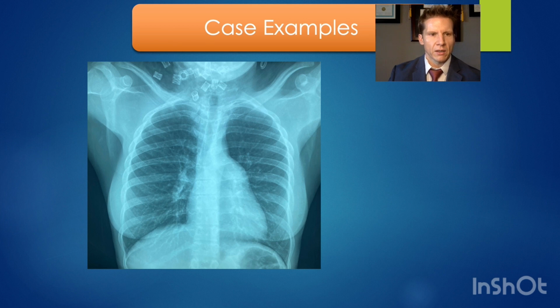And as we are going down, looking at the trachea, it's midline. Aortic arch is here on the left. And we're looking at the right heart border, that's normal. Left heart border looks normal. The size of the heart looks normal. But as we're going up here, looking in the AP window, this segment of the heart, which is the main pulmonary artery segment, is convex, so it's enlarged, and that is a sign of pulmonary arterial hypertension. The lungs going through, they're otherwise clear, and there's no other abnormalities.